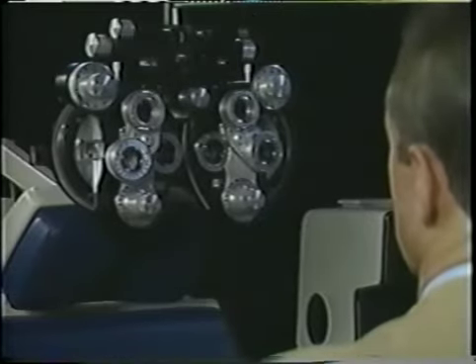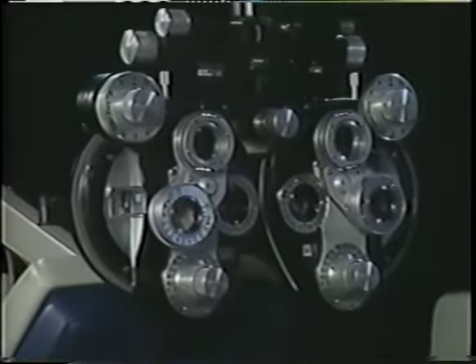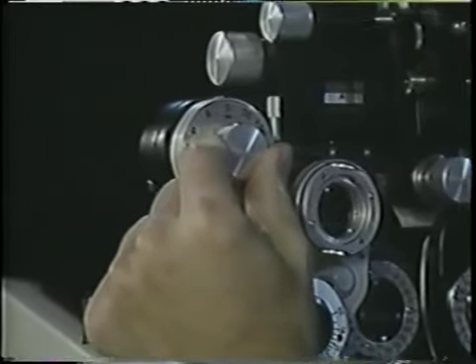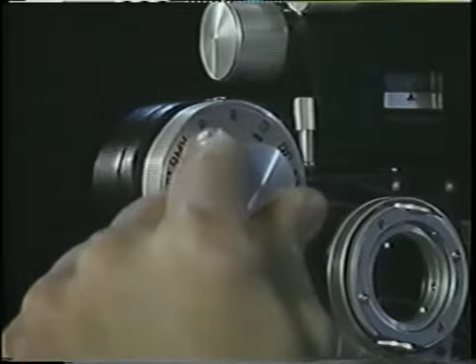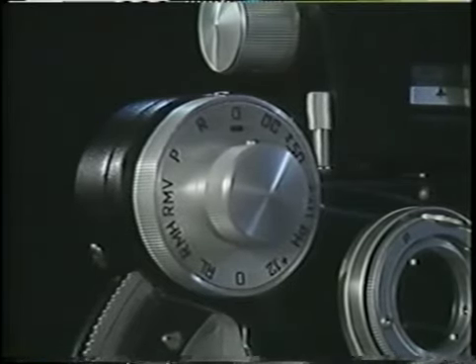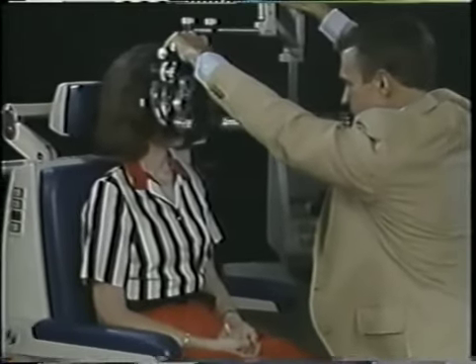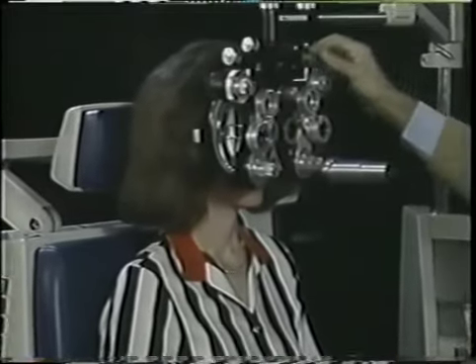Instead of compensating for the working distance by changing the sphere dial, the auxiliary setting R on the Reichert phoropter brings in a retinoscopy working lens of plus 1.5 diopters. This is dialed in at the beginning of the retinoscopy and simply removed at the end. Many retinoscopists prefer not to use this extra lens, for it increases the number of reflections to worry about. Once neutralization of the schematic eye is mastered, it is time to turn to real patients with real eyes.